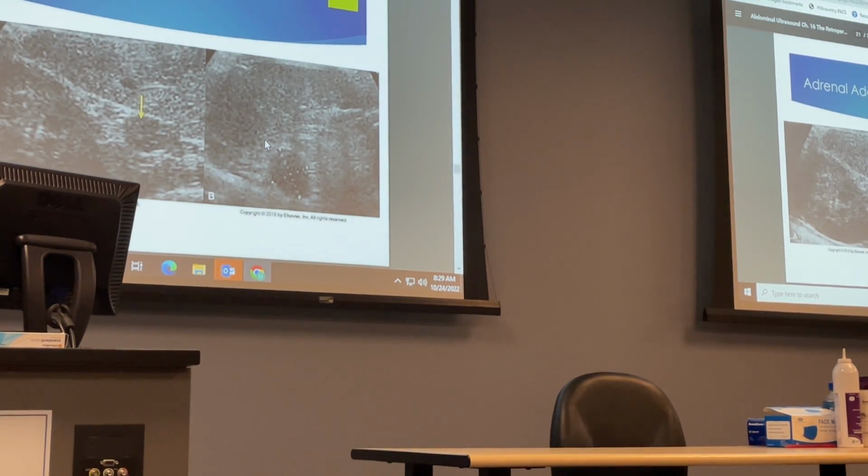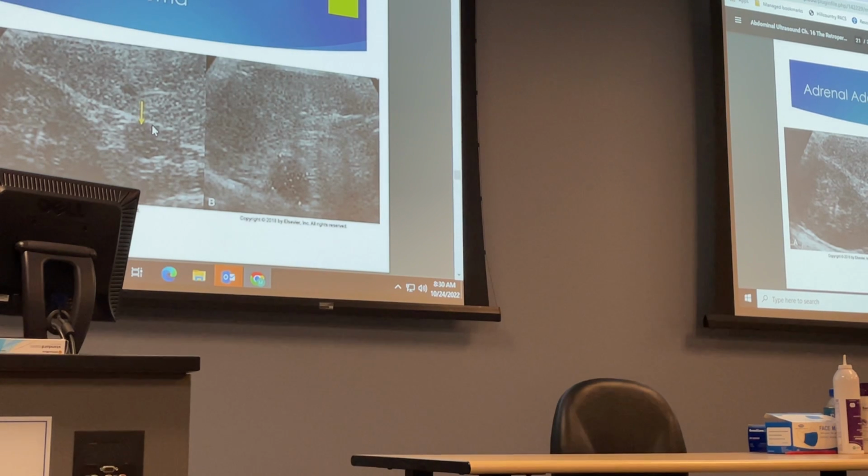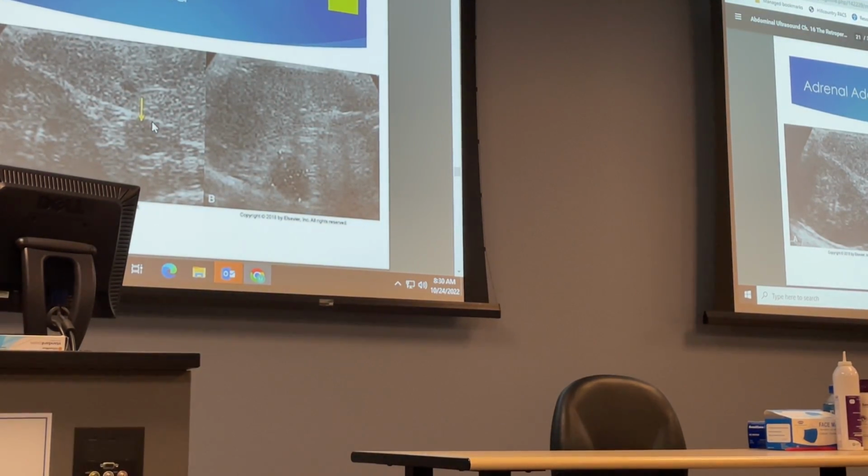Okay, next thing, adrenal adenomas. That's another one I want you guys to know. With adenomas, remember, it creates more of that halo on the outer aspect. So if you look right here, you can see the outer halo that's present even on this one, meaning that you're able to differentiate the adenoma from the actual normal anatomy. Okay, so remember this pathology when it comes to an adrenal.